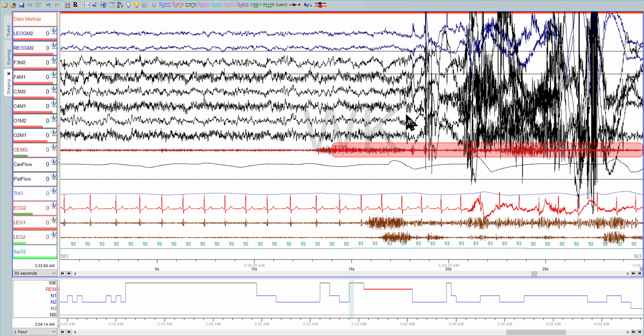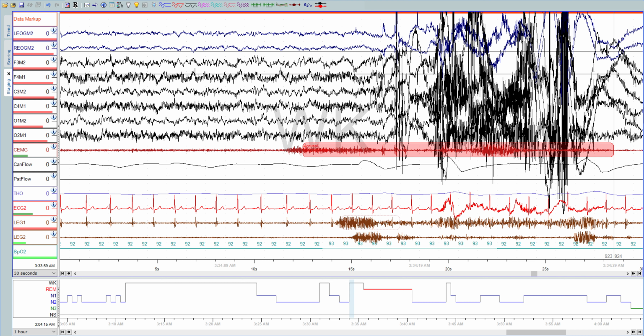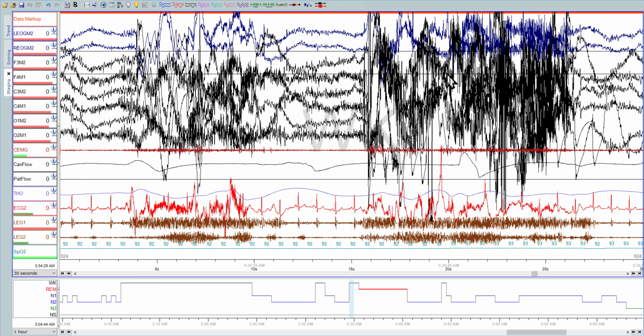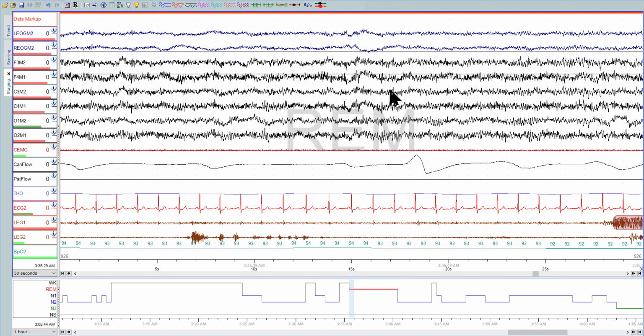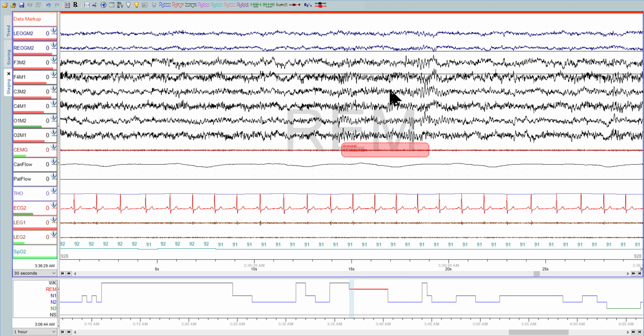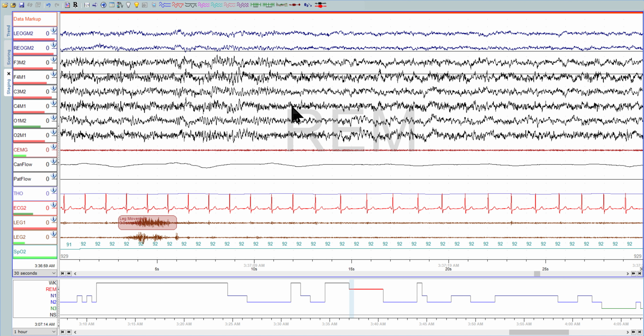Two, good arousal. Two, I think this is actually stage two still. The arousal doesn't really start till there. And wake, wake, wake. REM, huh? I think I'm going to keep this in wake for now. And then one here.